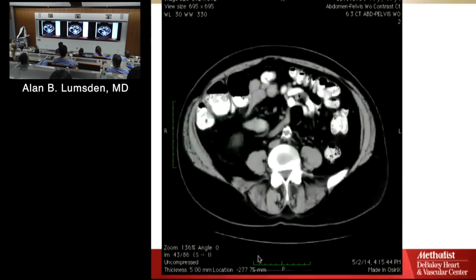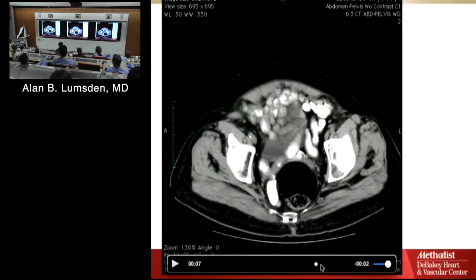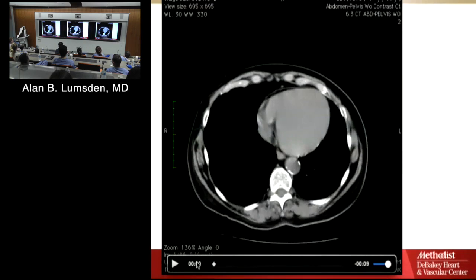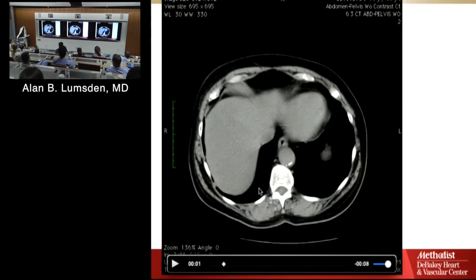Stomach, and then we're going to go down. You get a quick look at this. Now we're going to go down through these things. So this is all anatomy. Think anatomically when you're looking at these things. Descending thoracic aorta. This is taking over where the other one left off. Comes to midline. Okay. What's that? Air-filled structure in front of the aorta.